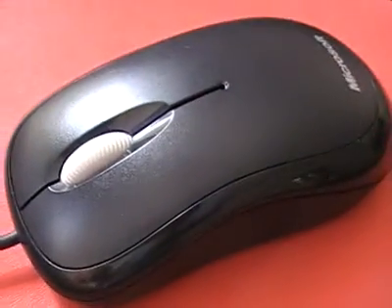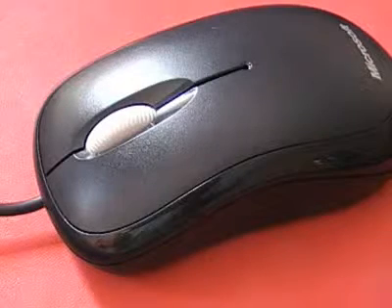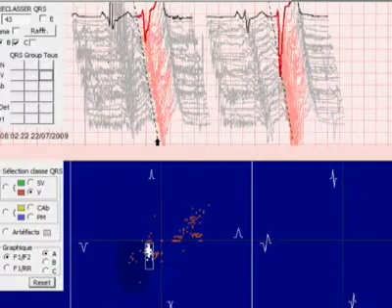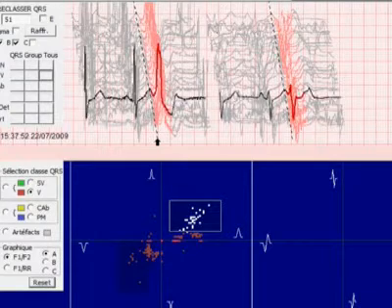We recommend you use a mouse with a scroll wheel to work comfortably. It helps to move much faster in 3D ECG, and you will not have to move the cursor on the left side or use the up and down arrow buttons on the keyboard.